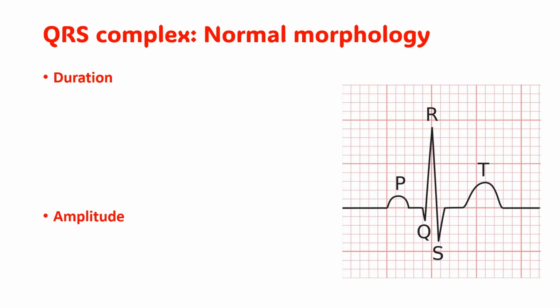Okay, so let's talk about some normal morphology of our QRS complex. Okay, so let's talk about the duration first.